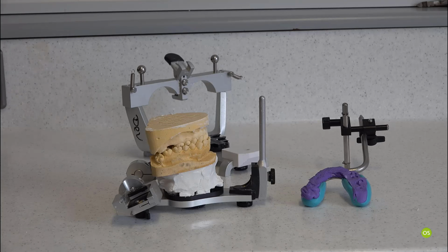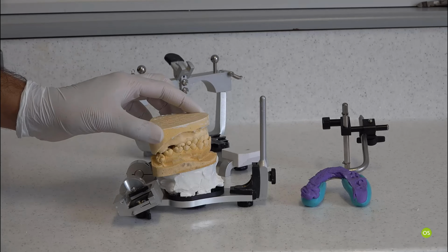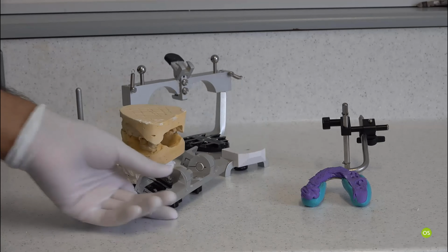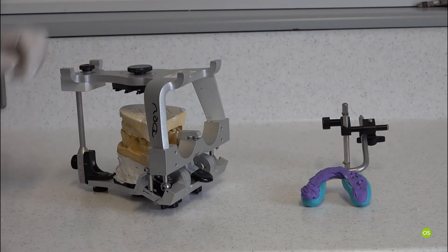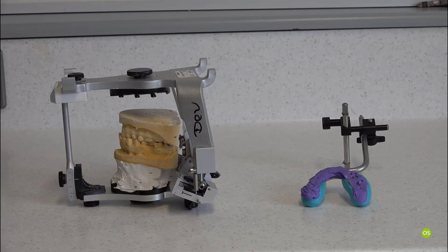If there's a posterior teeth missing, then I sometimes request bite registration wax or something, where I could take a bite registration while doing records for ICP. But in this case, the lower model is pretty stable and is going into the upper model very well. So now I will just assess as normal the height, and I will start mixing the plaster and mount the models.